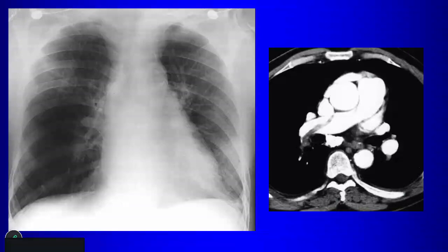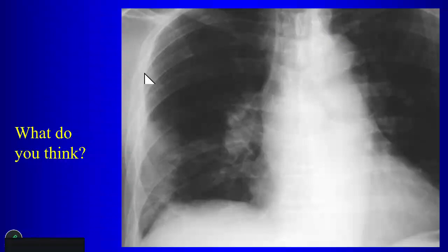Yeah. Because you're not getting oxygen exchange, the mechanism of the lung is to shunt the blood flow away from that area. That will cause decreased perfusion to that area, and so that's why it can look more lucent on the chest radiograph, since blood is shunted away from that area. All right. So here, what do we have here?